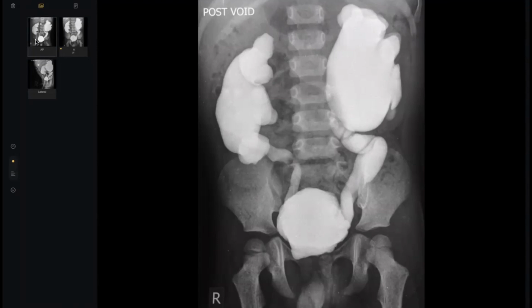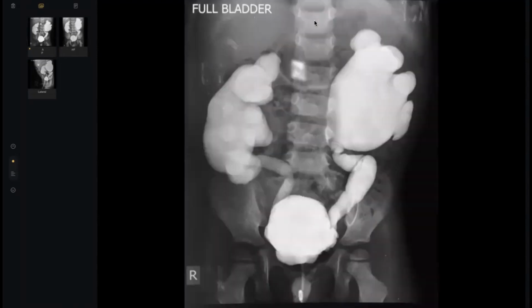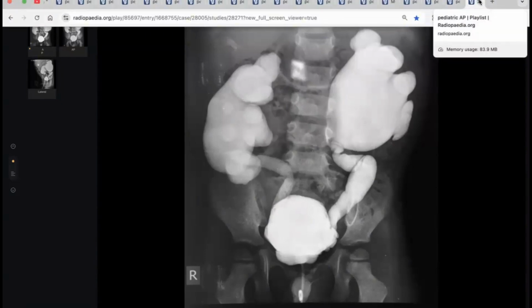You did very well when you told me you will look at the spine to rule out a neurogenic bladder. Neurogenic bladder gives something called Christmas tree. What does this mean? It means it has a summit, irregularity. I think I have one case for neurogenic bladder. Thank you, doctor, so much. Next candidate.